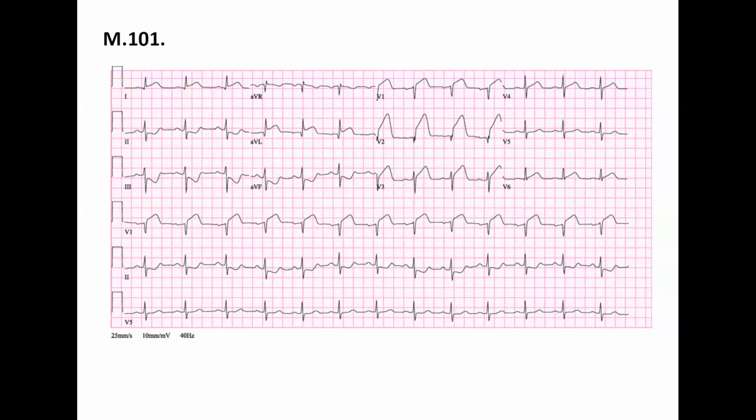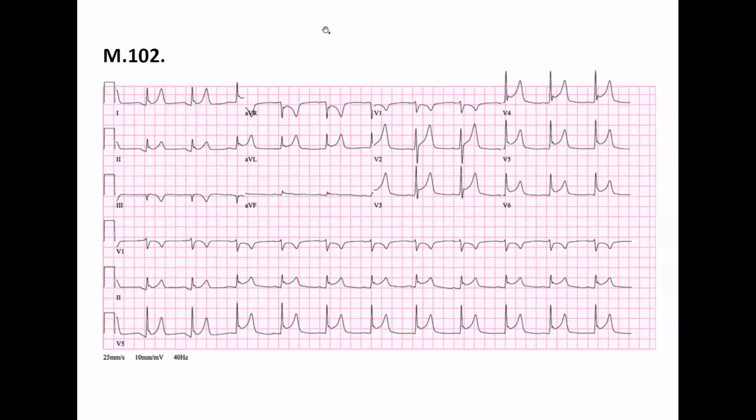All right. Who has these tracings? Can you hear me? Yeah, we can hear you. Okay, but nobody has this tracing. Okay, we can move on. Let's see this one. Yes, it's mine. Okay, so it's your turn.